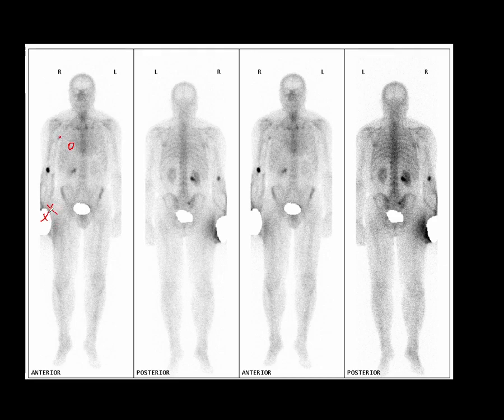So this is just soft tissue uptake, just extravasated tracer in the subcutaneous tissues causing diffuse uptake throughout the body. The scan quality is diminished, and we can have some nodal uptake. Probably still can't see a bone metastasis here, though. I expect we would investigate that further with a SPECT CT through this area to try and confirm that.